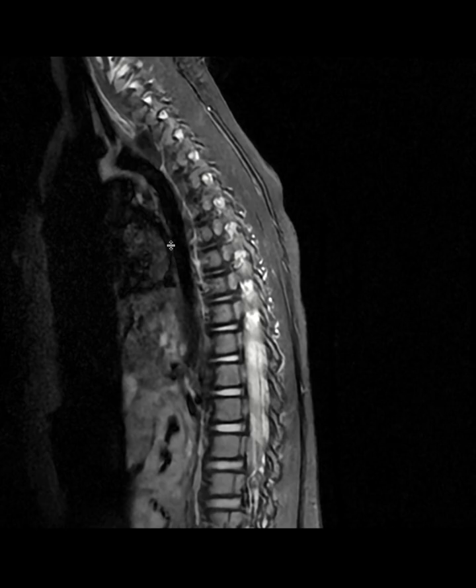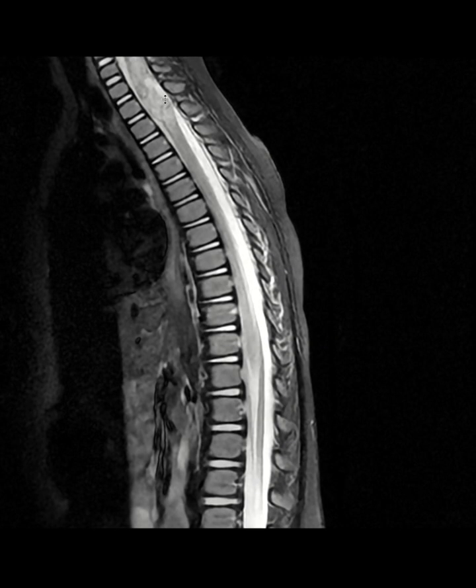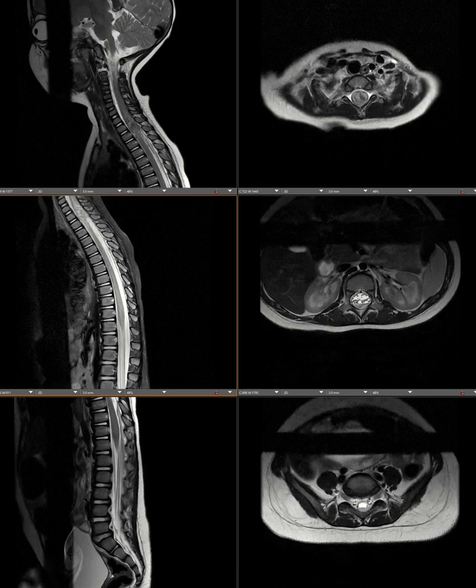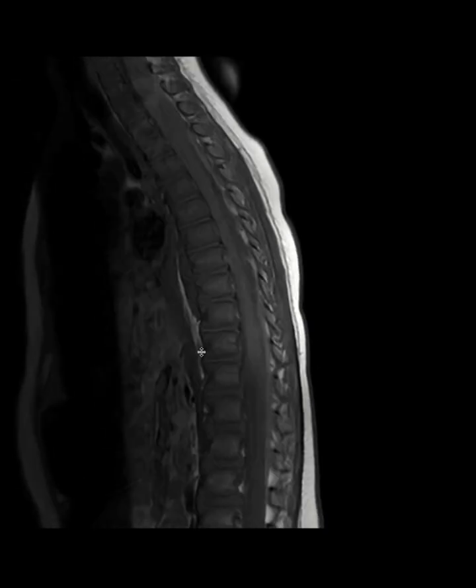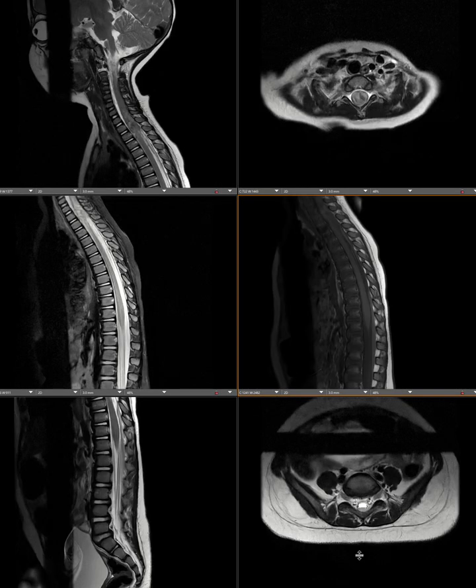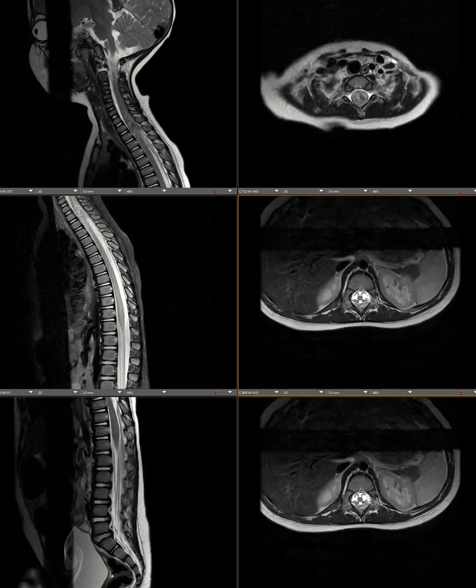When we look at the thoracic spine, we already know that this is the extensive upper thoracic cord injury. Then as we come down, we see some signal over there, and also some signals here. Let me show you the T1 sequence very quickly. When we look at the T1 sequence, it shows it better for us. We see some fluid collection in the dorsal epidural space of the distal thoracic spine and upper lumbar spine.